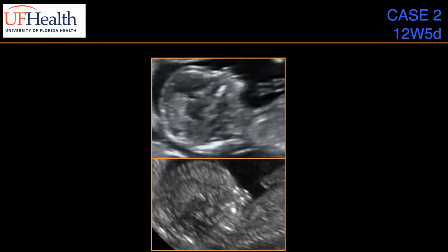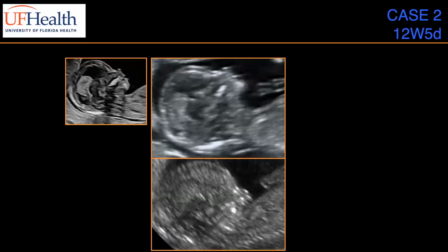Now we go to what I've called case 2, but they are in fact 2 separate cases. And here is an attempt at a mid-sagittal view of 2 fetuses at roughly 12 weeks, 5 days. Looking at this mid-sagittal view, what I would like you to pay attention to is the fetal maxilla, and compare it to what normal should be like. So in the top case, you will see that the proximal portion of the maxilla is completely missing, and in the bottom case, all the ossification of the bony structures in this mid-sagittal view are abnormal.